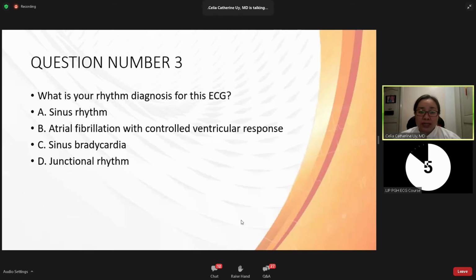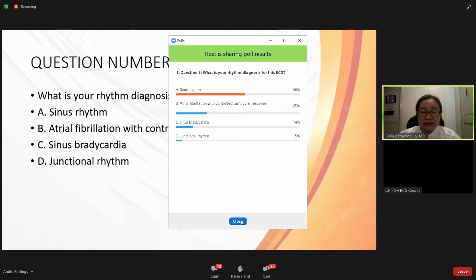So 5 more seconds to go for this poll. All right. 56% of you answered letter A, sinus rhythm.